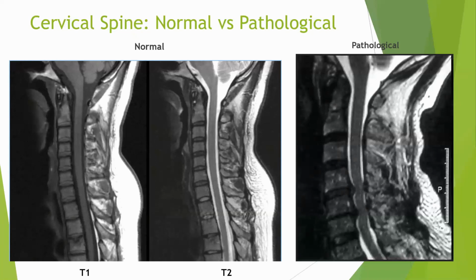You will see this noted by the radiologist in the report. There is loss of signal intensity or reduced signal intensity in this level. And that is exactly what I am noting. In these intervertebral discs, there is loss of signal intensity, because if there is water, there would be hydrogen ions or protons. And if there are hydrogen protons, it will be whitish or lighter gray in color, like over here where my mouse is hovering, and it will not be dark because there is no water or very, very minimal water, meaning the intervertebral disc is dehydrated.